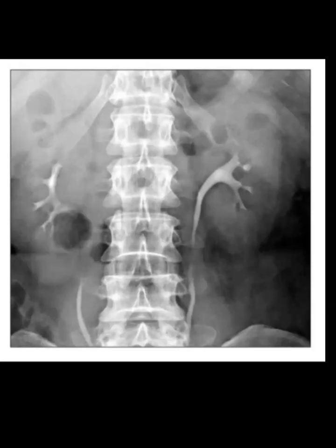They can also give you this type of nephrogram where they can show you the urothelial carcinoma. I am adding more slides, just a minute.